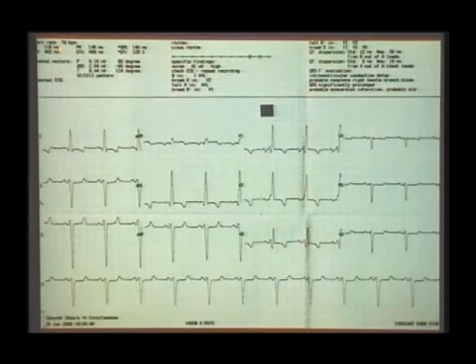It is smarter. It is counting small squares. When you count small squares, you will be more specific. When you count big squares, it will be 60, 75, 100, 150, only that, not 65. But 78, 89 come when you count the small squares. So always keep your eyesight good and try to count the small squares between two adjacent QRS complexes. This is how we calculate the heart rate.